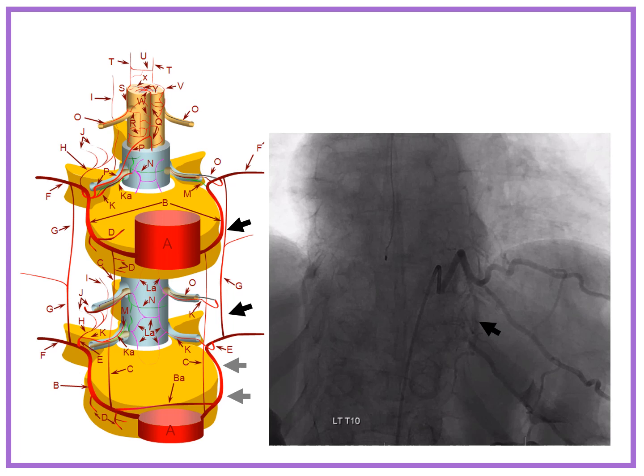The prevertebral one is C. And there's a post-transverse that's labeled I over there. That's by the spinous process. So anyway, this pretransverse anastomosis, which is the black arrows, is how the left T10 segmental artery is supplying the left T9, left T10, and left T11 intercostal arteries.